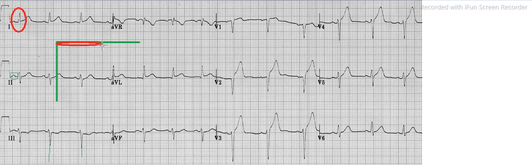So let's say this is our positive vector, and you see in AVF, this is our AVF, and here most of the QRS complex is negative. So drawing the negative vector, and the magnitude of AVF is greater than AVL.